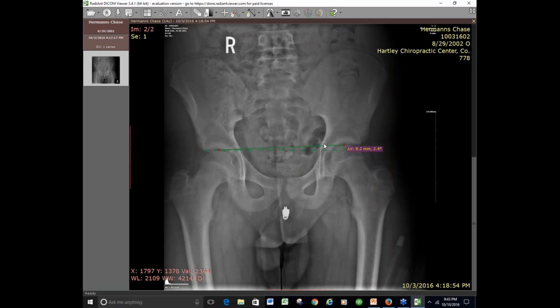How come a 6 millimeter lift created that kind of difference? Well, this place that we had sent him to, he went there, and we had not seen their x-ray equipment. So we went down there, and their beam was too close. Their beam was only like 32 inches.